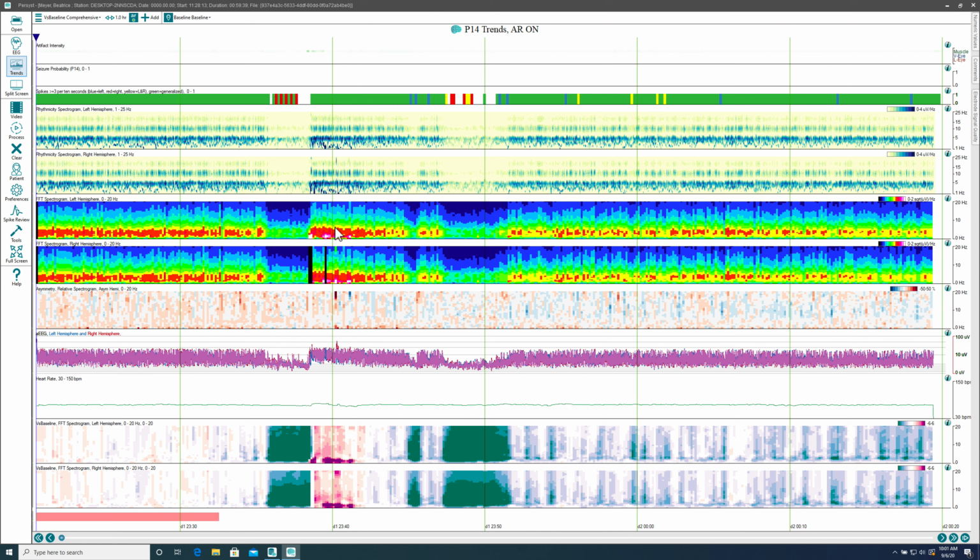Here is another record. This is a generalized periodic discharge record. Generalized discharges are marked in green. And red would be on the right, and occasionally the software is determining that they are on the right, but these are pretty much generalized discharges.